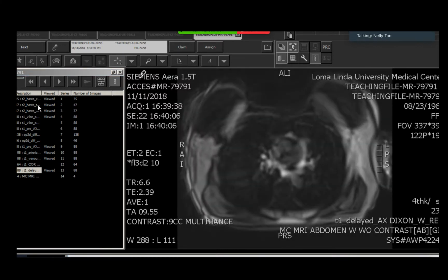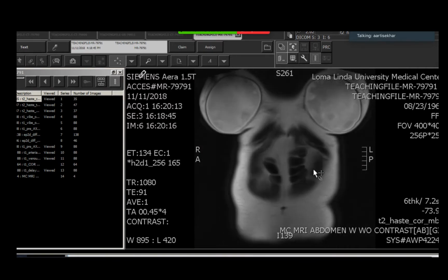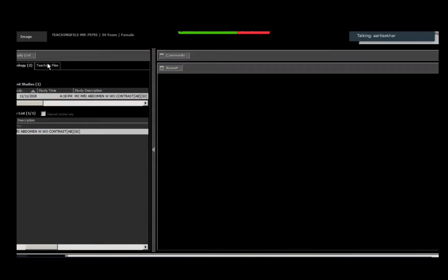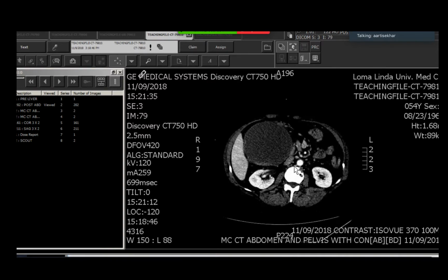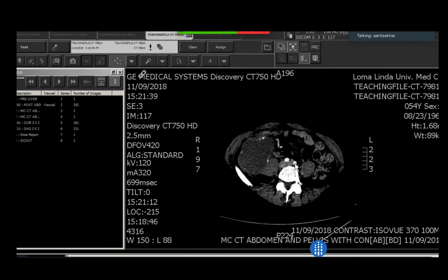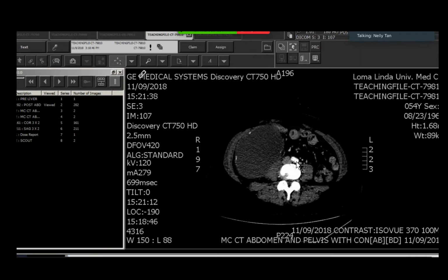Yeah. I couldn't tell what it was arising from. Do you? Can you? Oh, okay, let me go back. Mm-hmm. So it sounds like on MRI you didn't see any definite enhancing component? No. But the MRI was okay. It wasn't the most beautiful.